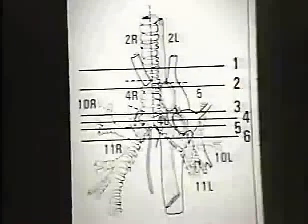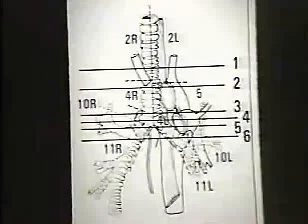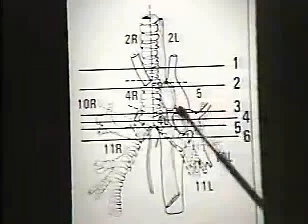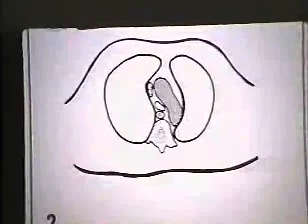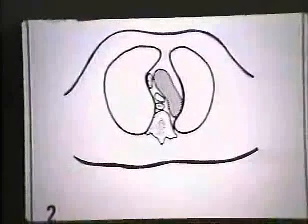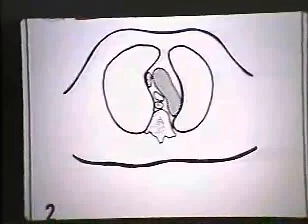Now, when you take a look at a scan, you may have a great series of images to look at, and you wonder where to start. Well, let's start at a familiar and convenient level. Let's look in the region of the aortic arch. Suppose we take a theoretical diagram through that region. What are the structures that we're going to use to identify the aortic arch?